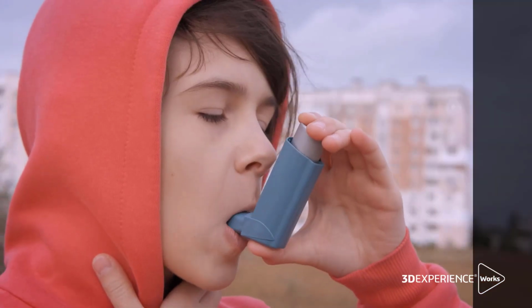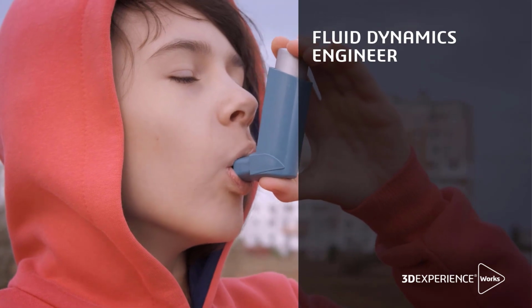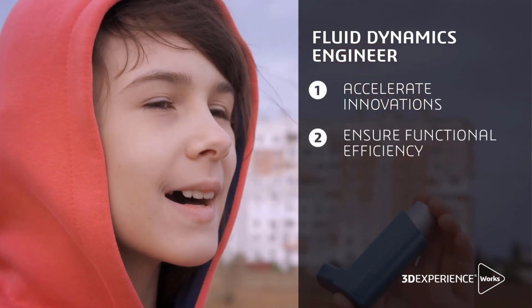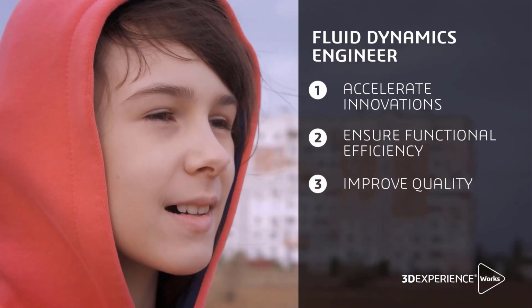With SIMULIA's Fluid Dynamics Engineer role included in the 3DEXPERIENCE Works portfolio, designers can accelerate innovation while ensuring functional efficiency and improved quality for patient-friendly medical devices.